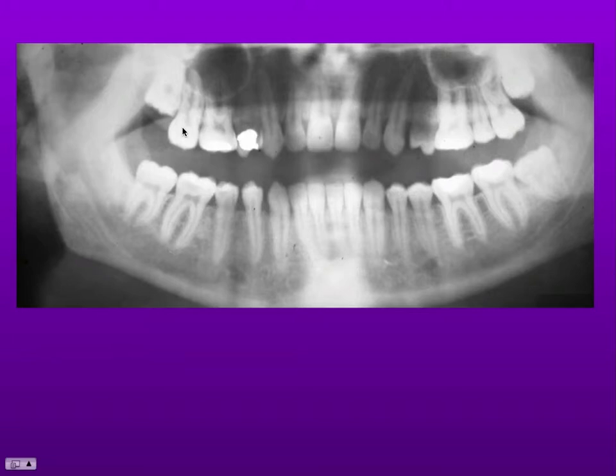So we've got 8, 7, 6, 5, 3, 2, 1, 1, 2, 3. Again, 4, and then 6, and a 5, and a 7 and an 8. Something's seriously wrong here. We've got a premolar either side of the first molar.